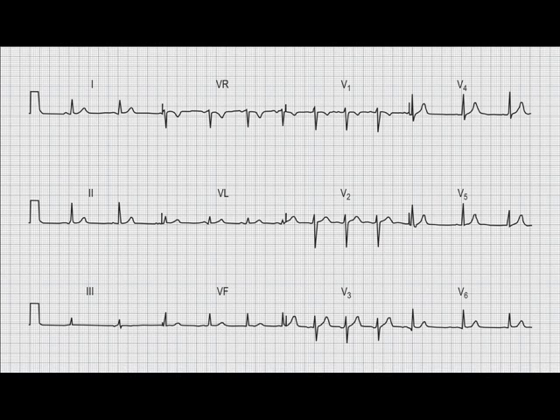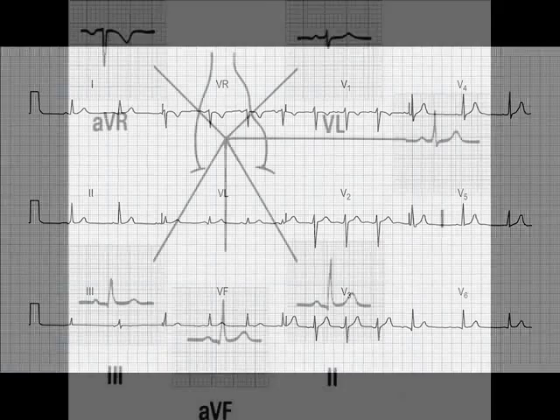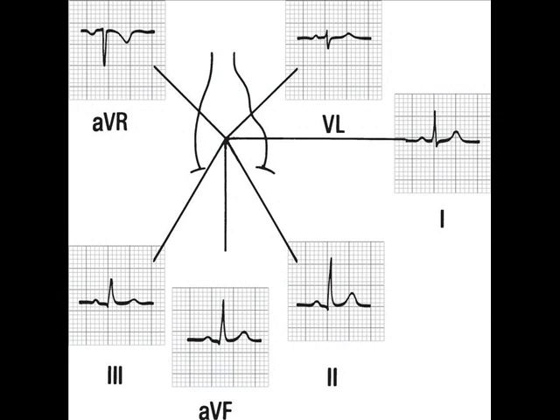Now, understanding this diagram is very important because I'm going to show you here the normal 12-lead ECG, and you can't really work out where those limb leads are looking unless you have that picture, here it is again, in your mind. So it's very helpful when you're out in clinical practice to be able to draw this quite quickly, perhaps on the back of the ECG, if your memory has failed you or you're still learning which area of the heart the limb leads look at.